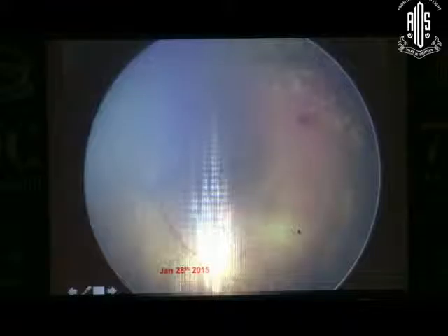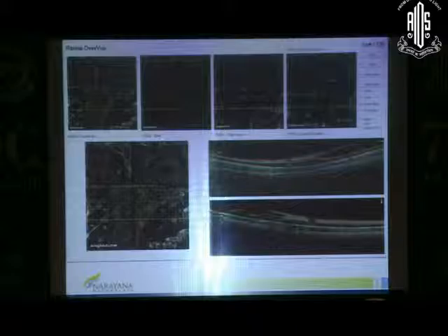This postmenstrual age is still about 33, 35, and then you see these ischemic pockets. You want to go this close, but you're wondering whether you need to do that in the first shot or not. So a week later, you get this ridge, which is very close to the possible destined fovea. You do run the OCT, and you realize it's less than 1 disc diameter from that ridge. So we tried the OCT angio both before and after supplement.